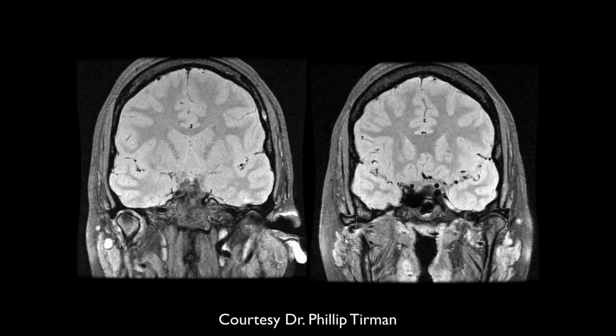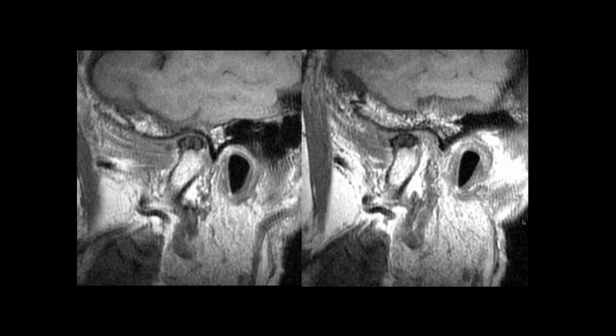And then you're talking about the disc, right, John? Right. And then here, this is anterior and a lateral displacement, and we can see there's medial displacement on the other side. What's going on laterally on that side? Here? On the other side, sorry. On the other side. That, yeah. I think that's just a normal. Or up top, the black. This, yeah, that's the bone. Oh, that's bone. Okay. And I don't know why there's artifact here. Okay. This patient might have had surgery on the other side. Anterolateral displacement. Okay.